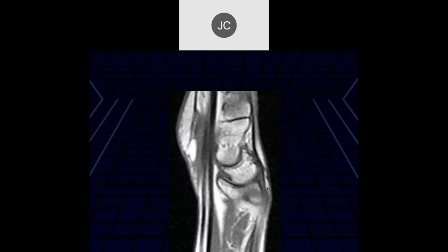So there's osseous involvement, it looks like, with the radius. What? Of the radius? You mean down here? Yeah, below that. Below that? Down here? Yeah. Well, here we're partial volume, just the edge of the radius. Oh, okay. This is the distal radioulnar joint space. This is muscle fat.